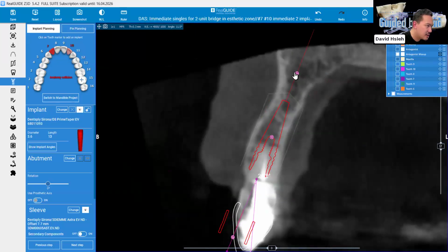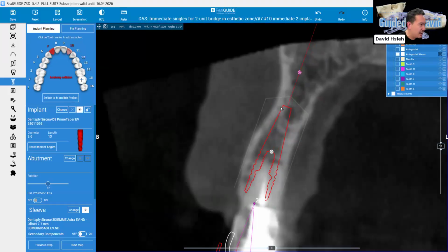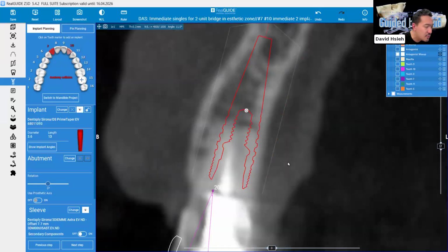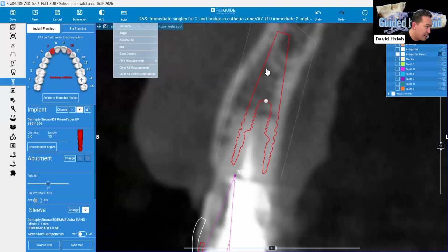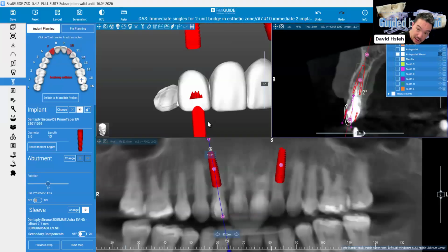So that's the beauty of digital treatment planning. But yeah, I think we can still push a little more, because the bone resorption happens on the ridge a lot, but on the tip of the implant it isn't that critical. So we can also tilt the head back a little bit. The lingual side of the neck of the implant is very rich in blood supply, so you always get less bone resorption around the implant. So that's great, giving us a better trajectory, basically aiming for the incisal edge.